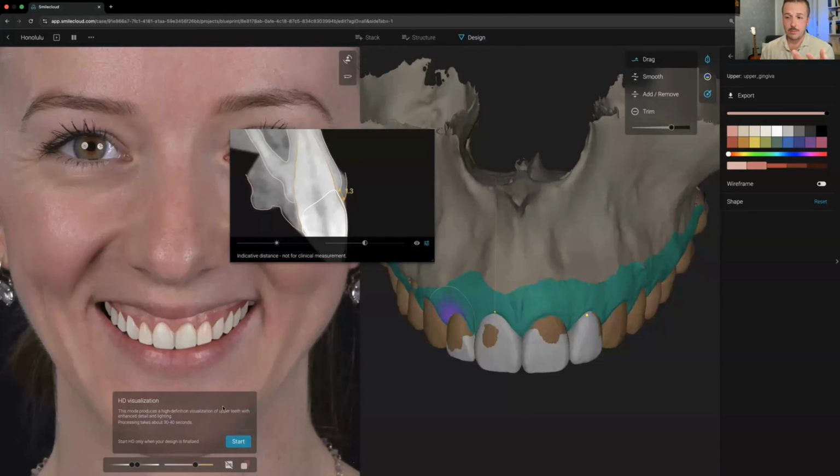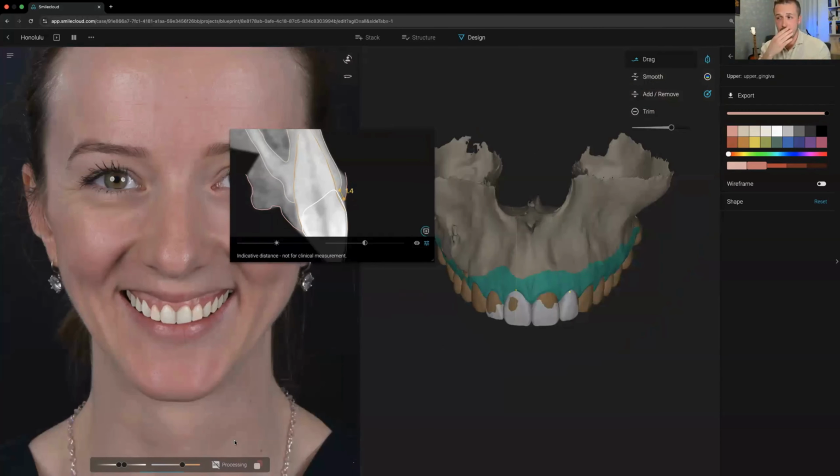So in this case, when I'm designing this, I can present it to her and tell her, okay, but we have to do crown lengthening here because you want to have longer centrals and symmetrical centrals. It would be nice if we could achieve the restoration looking like this instead of this. I think it's much better. So I can show her like this. She can decide. And in this case, I have everything I need to see here, whether I have to do crown lengthening or maybe not.